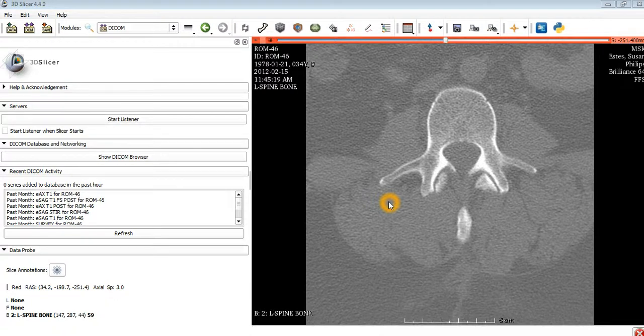Hello there. Today I'm going to show a demo of the latest software update that I have. This is for software I've been creating for the University of Colorado School of Medicine Department of Spine Orthopedics. And the general idea of the software has been to extract anatomical surfaces from medical imaging data.